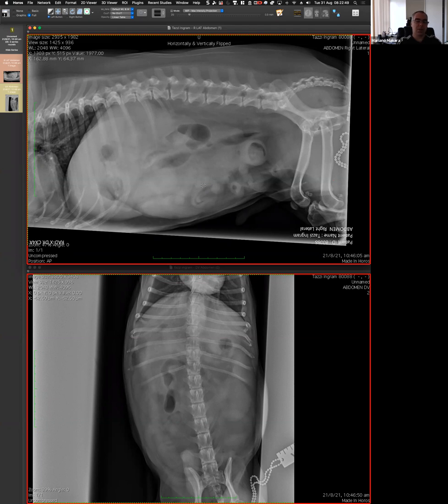Let's say you're working with this dog. If you need to weigh your certainty about these findings, how certain are you that it's abnormal? I like your consideration about what it may be, because its gas field is tubular. So I think we have the right to say it's bowel.